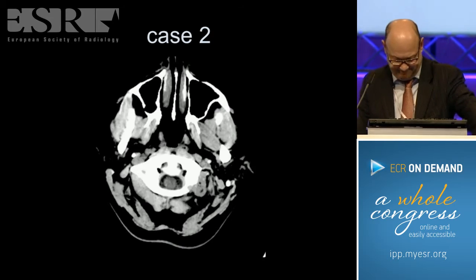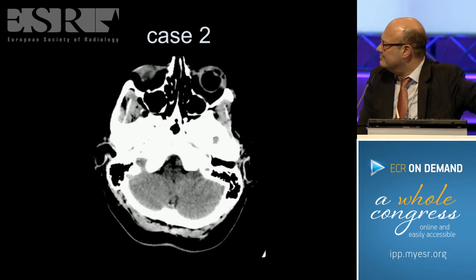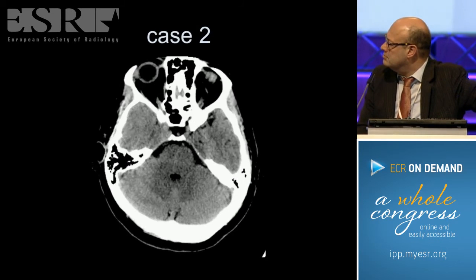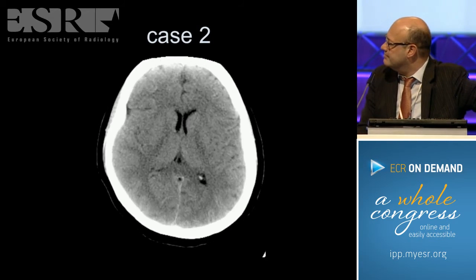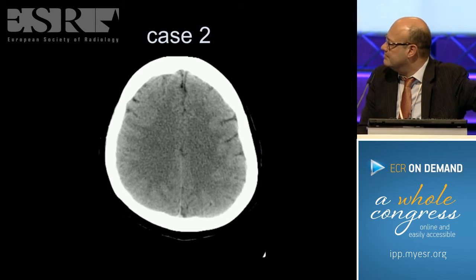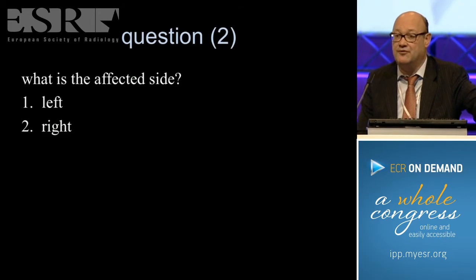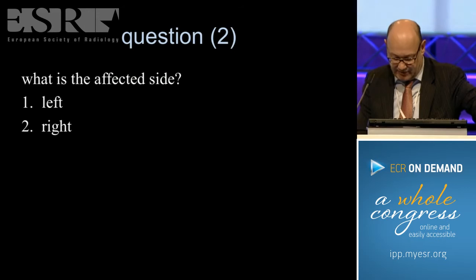So again, looking for stroke. Is there a cause for seizures? My question to you is, what is the affected side? Is the abnormality at the right side, or is the abnormality at the left side?